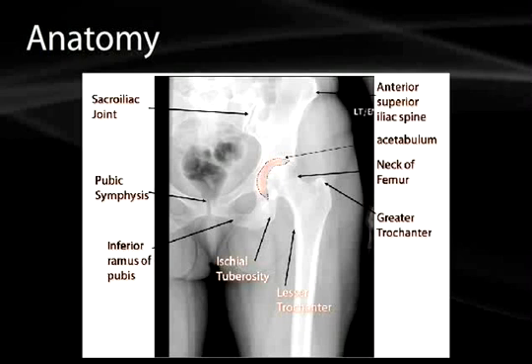Notice how the pelvic brim is easily visible, and this is a point where you want to follow around the edge of that pelvic brim and make sure it's nice and smooth, and look for any differences between the left and right side of the os coxae as they attach there. You can see the inferior pubic ramus. This is where the genitalia and the perineal membrane will come across. And then finally the ischial tuberosity, which is projecting posteriorly. Look for avulsion fractures along this area, especially in a younger population.